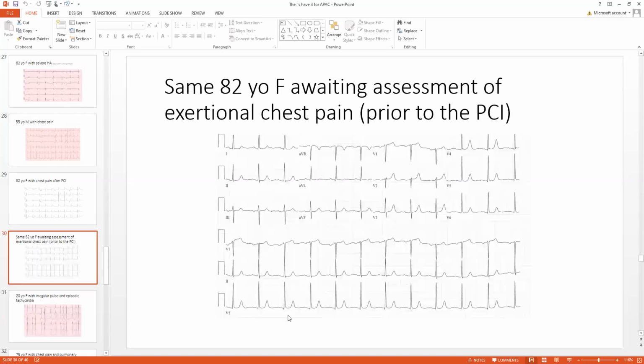Here's the electrocardiogram that she had before. There was no right ventricular infarction. This is before the PCI. And there was no inferior infarction either. But when the patient complains of chest pain after a PCI, do an EKG and do what's right. Take the patient back to the lab and see if you could unjail that right ventricular branch.